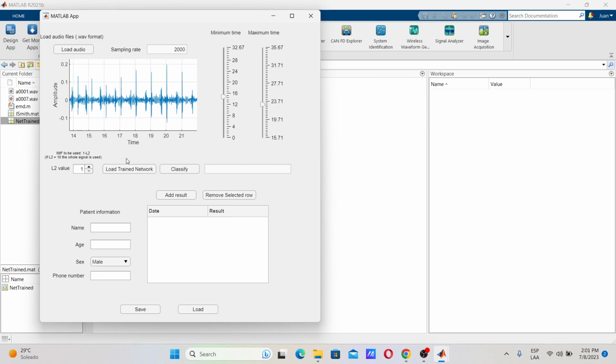And now to the classifier itself. Our classifier deconstructs the signal into its different intrinsic mode functions. Then it reconstructs the signal with a few of those intrinsic mode functions, or IMFs, and then tries to use our classifier, which is a deep learning network.